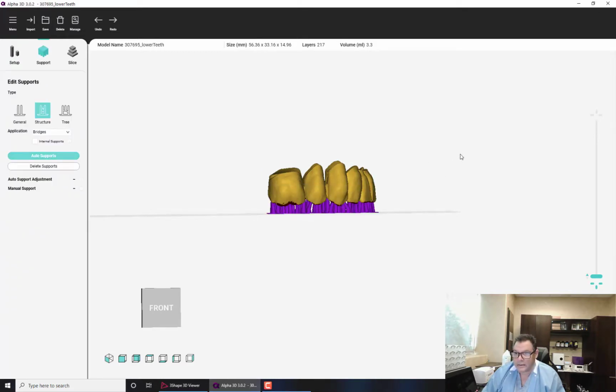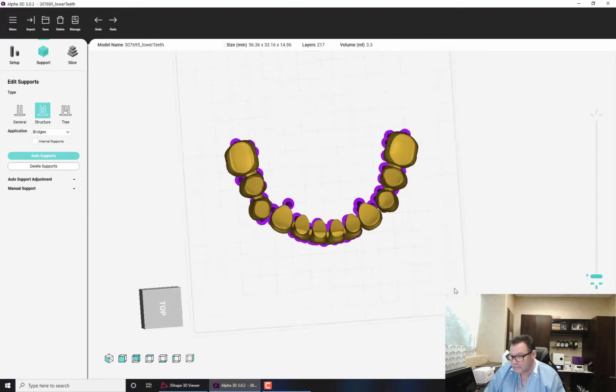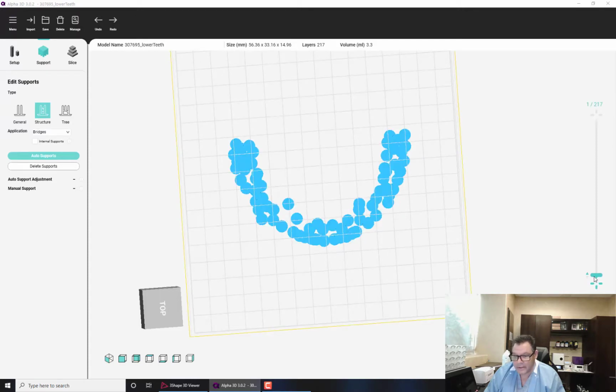And then I'll go through an exercise that's very important for you to know. Let's turn this upside down. This slider is going to show me the layers as they're printing. So initially when I move it up, everything in blue is going to be pertinent to that particular layer. When I go through and I'm testing my part, what I'm looking for is these areas of red as they're forming, and I want to make sure that there's a support under the area of red.